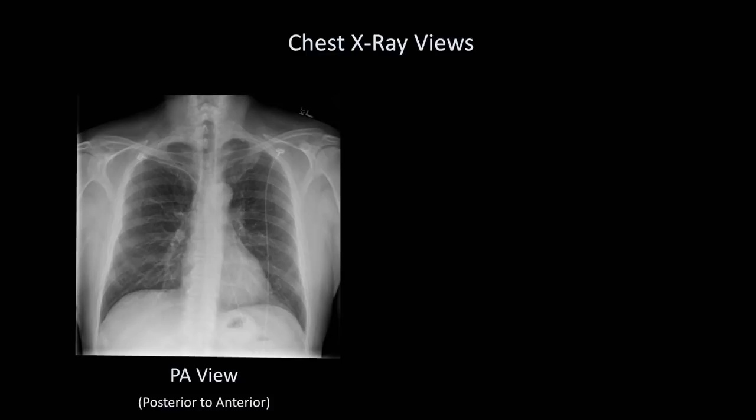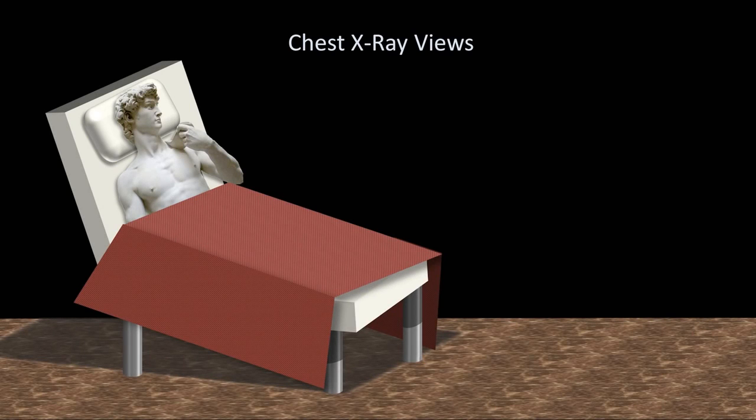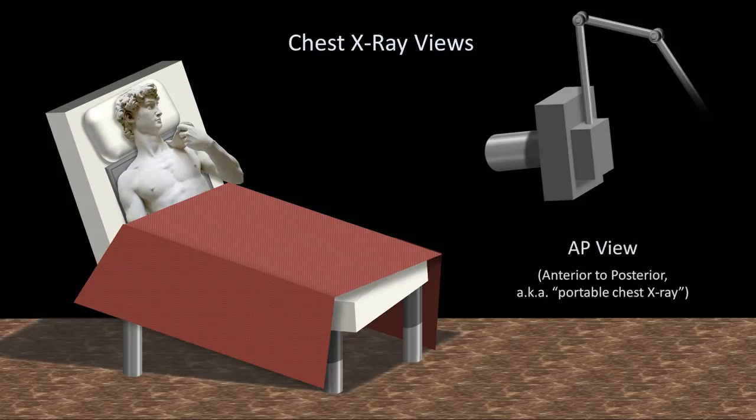In most cases, the PA view will automatically be accompanied by the lateral view. As the term implies, the lateral view is the two-dimensional projection of the patient's internal structures as seen from the side. The PA view should be distinguished from another situation common in the hospital where patients may be physically unable to stand due to weakness, confusion, surgical wounds, or invasive tubes. In that circumstance, when the patient is in a hospital bed, a portable X-ray source will be wheeled into the patient's room. An X-ray film will be placed into a metal tray and slid behind the patient's back, and the X-rays will be passed through the patient front to back. This is formally known as the AP view, though more commonly known as a portable chest X-ray. AP films are inferior in quality to PA films for a number of reasons, some of which will be discussed in Lesson 3 and some in Lesson 5.